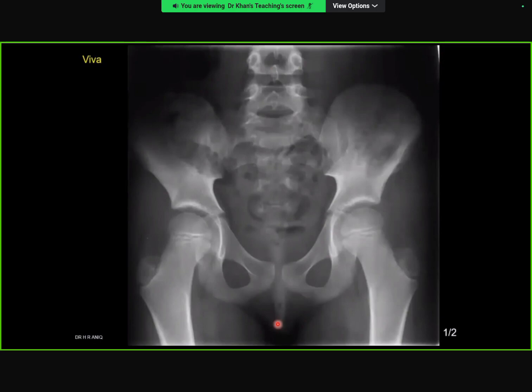So in the iliac crest, compared to the contralateral side, there appears to be a periosteal reaction or cortical irregularity. There's also possibly some lucency within the medullary cavity within the ilium. The appearances overall are aggressive, and again, I'll be concerned about an aggressive process such as Ewing's, osteosarcoma, or infection, and would recommend an MRI.